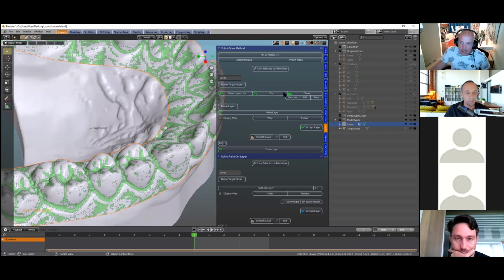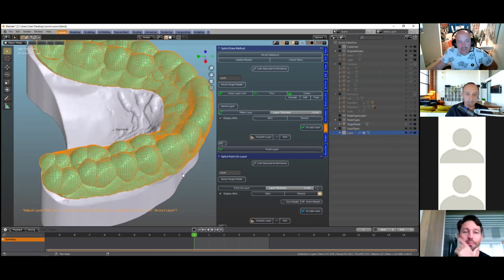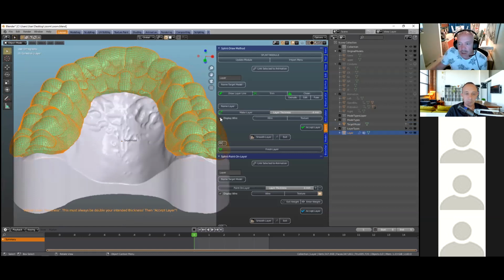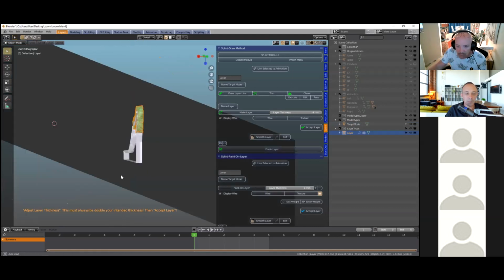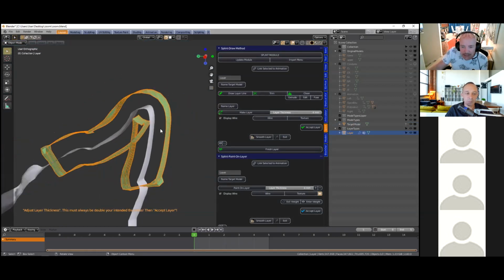So here, once we've cut it, we're going to then click on Make Layer. So this gives us a layer, and don't be mistaken, we are not in edit mode. Some people are confused because it lights up in orange. So you can unhide the lines, and you'll notice it's a really rough and horrible looking mesh layer. By that I mean, if we go into cross-section mode, you can see everything is like doing this. So we've got to deal with this inside, okay?